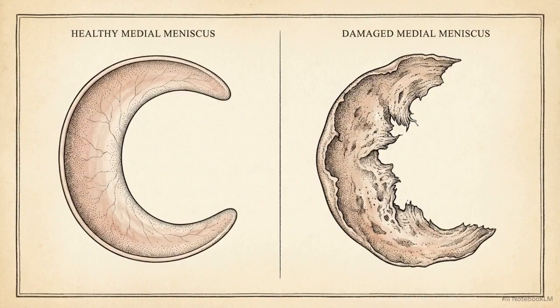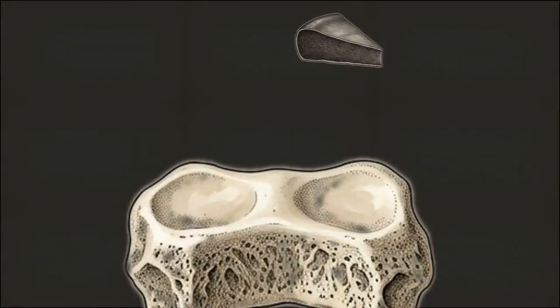When fluid separation is absent, the diagnostic target shifts from a gap to structural irregularity. This is a simulated T2-weighted sagittal view. Instead of looking for a fluid void, observe the contour deformity at the posterior periphery of the meniscus. This wavy, irregular edge is produced by torn and retracted attachment stumps.